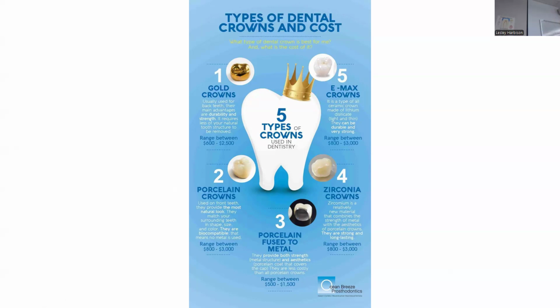So dental materials is harder in the way that we don't go into depth. Obviously, we're kind of breezing through it in like 15 minutes. So the big things that I want you to pull from that is the difference between amalgam, composite, and maybe the different types of crowns. Being able to say this is a PFM versus a full gold cast, or a porcelain crown. Porcelain's going to look much more radiolucent. And then knowing the difference also between the material: gutta percha is going to be more radiolucent, silver pins and posts and things like that are going to be more radiopaque.